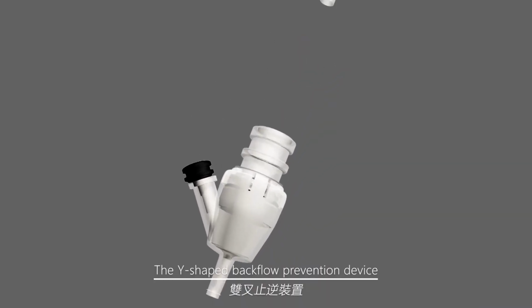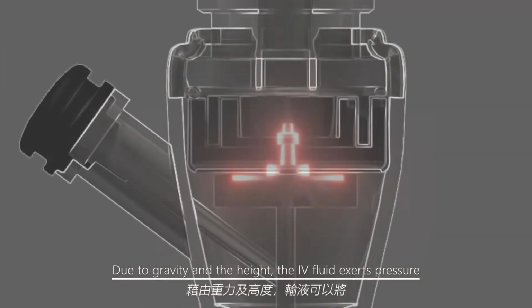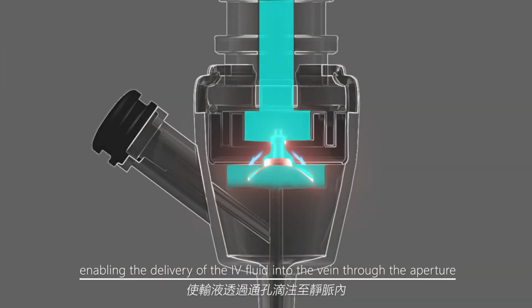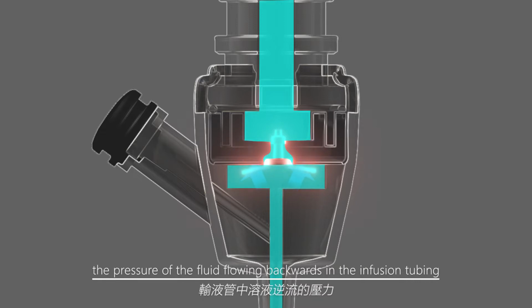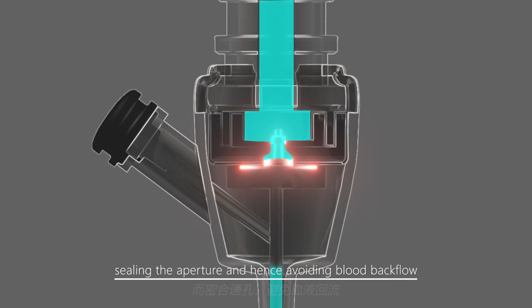The Y-shaped backflow prevention device, due to gravity and the height, the IV fluid exerts pressure downwards on the elastomeric umbrella valve, enabling the delivery of the IV fluid into the vein through the aperture. In contrast, when the peripheral venous pressure rises, the pressure of the fluid flowing backwards in the infusion tubing will push the elastomeric umbrella valve back against the valve seat, sealing the aperture and hence avoiding blood backflow.